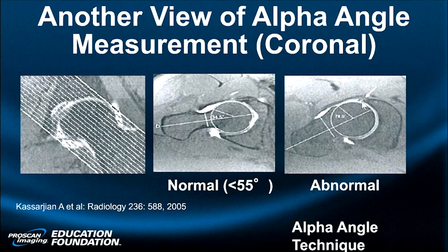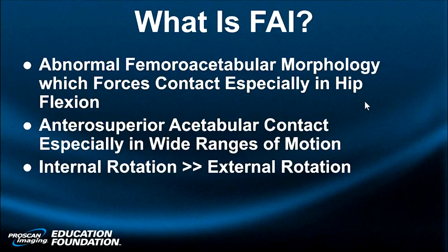Now, anterior superiorly, you should not see a sulcus. You should learn to differentiate the space between the capsule and the labrum right there from an actual tear, which is in the substance and typically between the labrum and the adjacent acetabulum and hyaline cartilage.